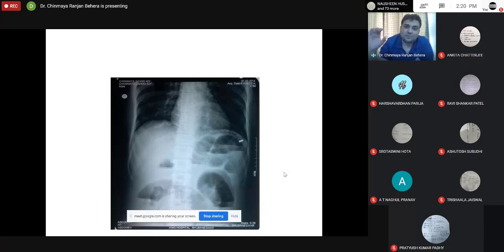Have you seen spiral binding books? So the circular rings are there, spiral things. So valvulae conniventes, you will see like a spiral thing with a complete circle. Okay, so that suggests this is jejunum.